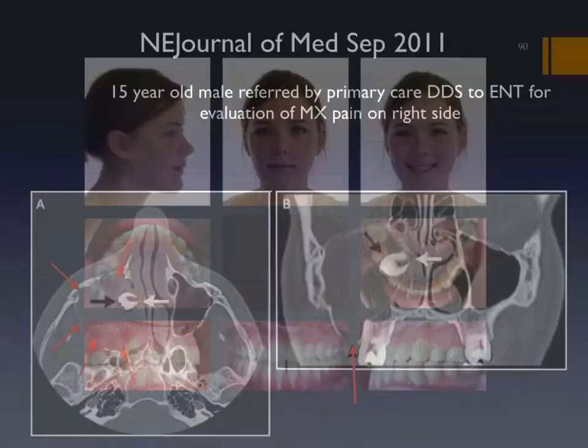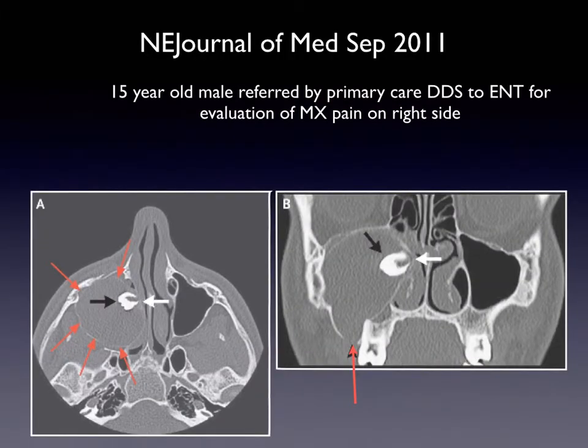Sometimes teeth do get away from you. My son is a doctor who sent me this article from the New England Journal, about a tooth in the sinus. I thought that was pretty interesting. It had caused the sinus to actually get deformed, remodeled, and also caused a fistula. That's how they discovered this whole thing. And you can see how the septum is kind of displaced by it as well.